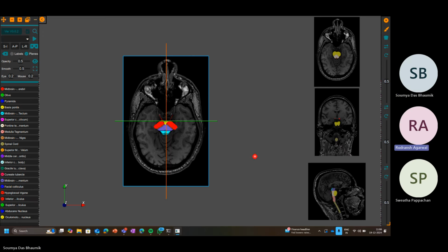Okay. So firstly, when it comes to these 3D structures, there are three planes, because it's in 3D. As one would expect, along the x-axis, y-axis, and z-axis. But anatomically speaking, they call it superior to inferior, anterior to posterior, and left to right.